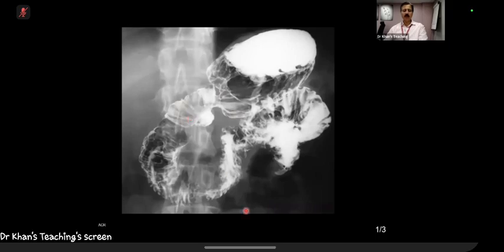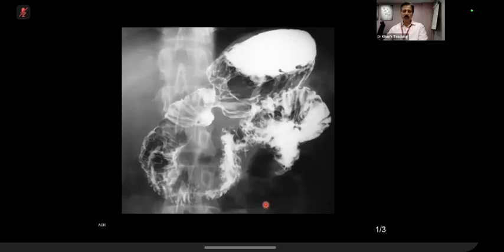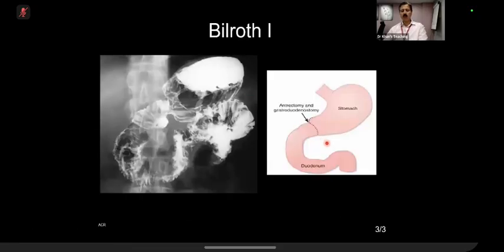And GIT, it is again post-surgical. The antrum looks a little bit smaller, perhaps reduced, I guess. So which kind of surgery has been performed? Antrectomy. Excellent.